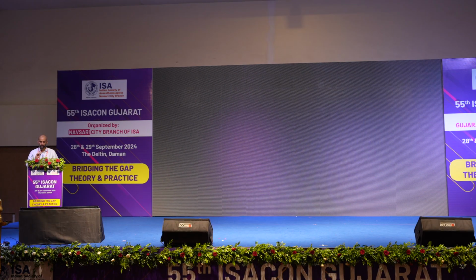Here, I'll just do a very brief 2-3 minute recap of what we discussed in that session, and then follow up with analysis of the key points you need to identify on a ventilator waveform.